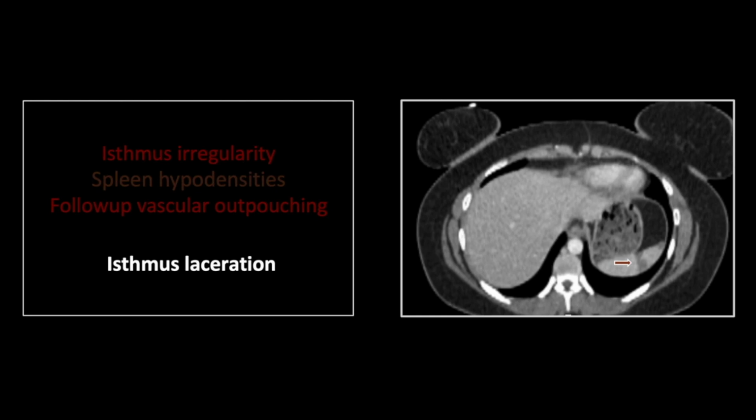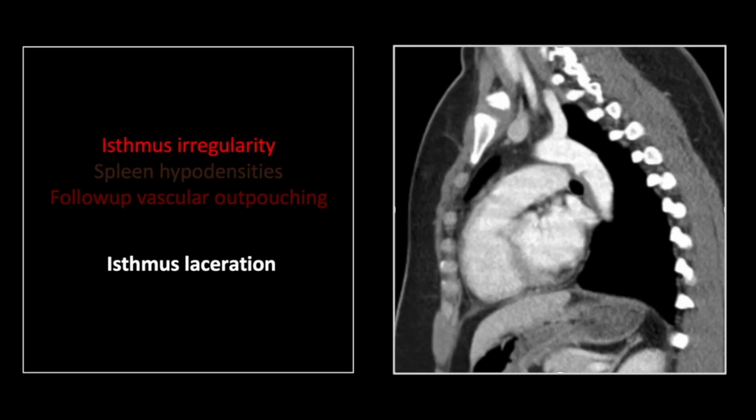In the abdomen, this patient has peripheral wedge-shaped, well-circumscribed hypodensities in her spleen, consistent with thromboembolic infarcts. That, in turn, in the setting of trauma, is suggestive of an upstream large vessel injury. Note the significant absence of perisplenic fluid.